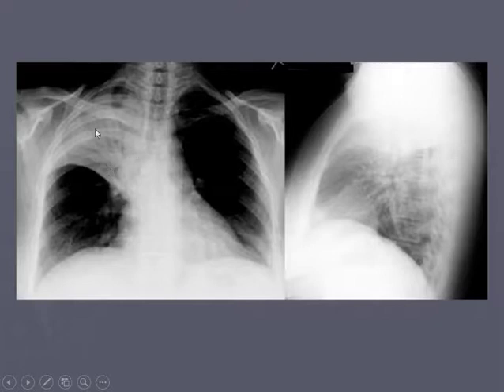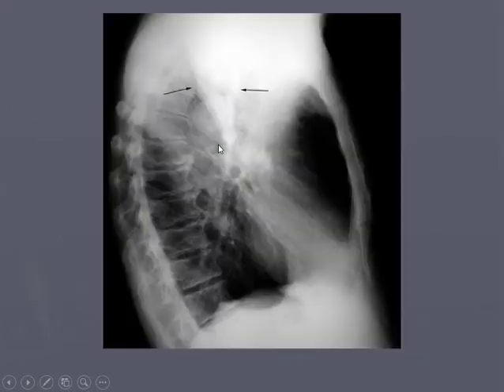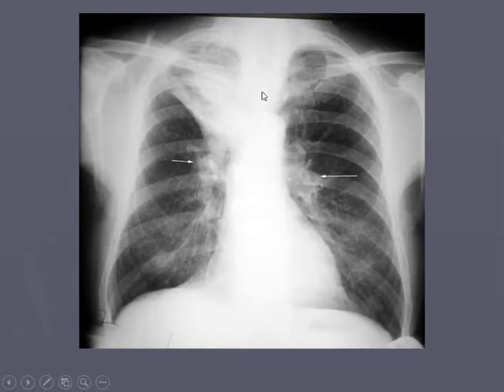So how can I say this is not an atelectasis? Well, going through the A, B, C, D, E, F method, A, I have airways, so I got a nice V'd carina. Okay, nothing's yanking on that. Over here on our other film, you can't really see the carina at all. I can see that the trachea is maybe a little deviated to the right.